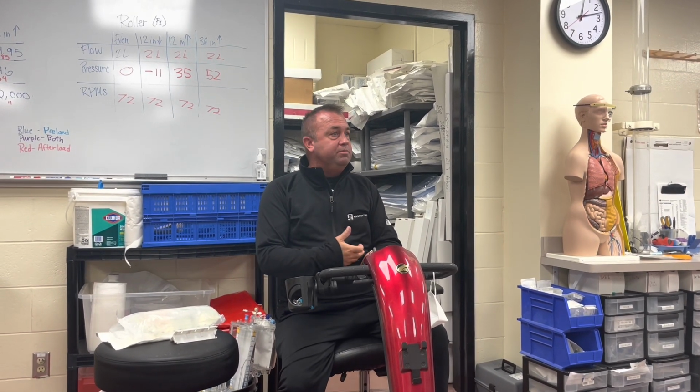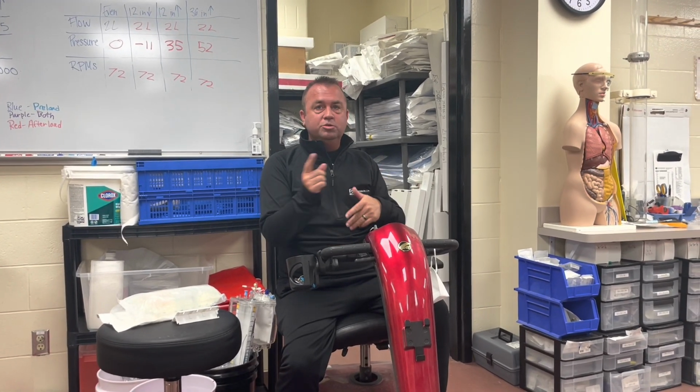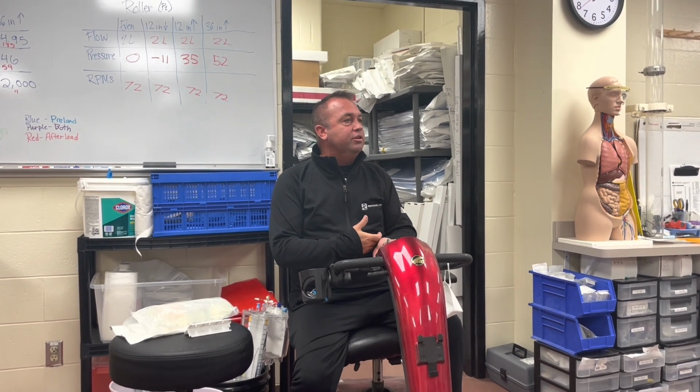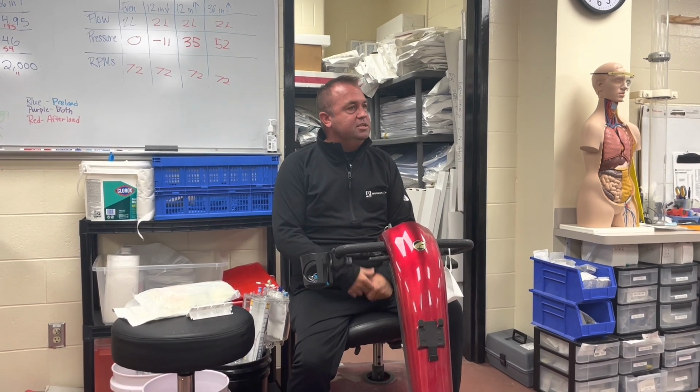Heparin obviously will keep that catheter from being clotted off. Mixed with the pressure in the bag, which we're going to get to just in a second, it will flush that arrow catheter in the vessel and keep it from clotting off. That's number one.